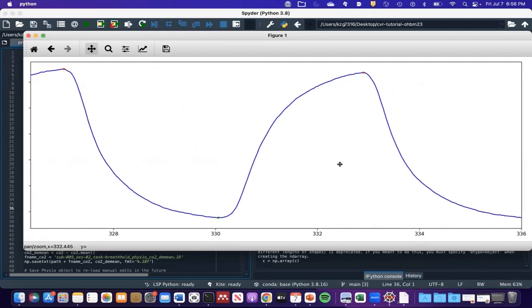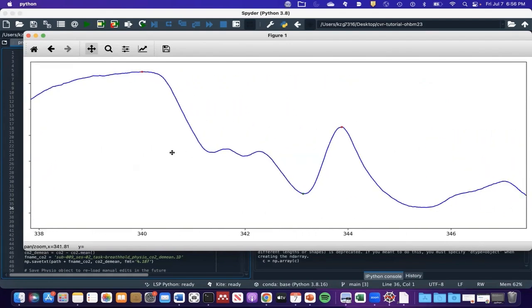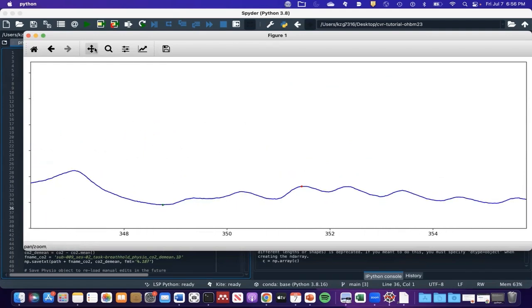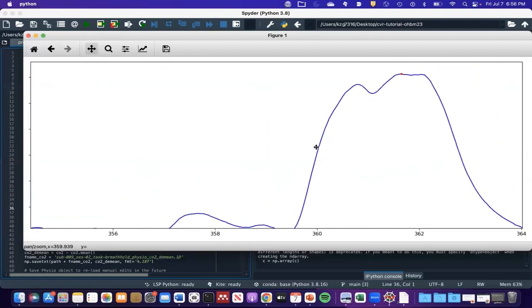We don't want to include that one again. That's sinusoidal. And it's now in a breath hold period as well. So we don't want to include these. That peak looks okay. This one looks okay. Also notice I zoom in this far just to see each breath very clearly, and I like to see the trough and the peak.